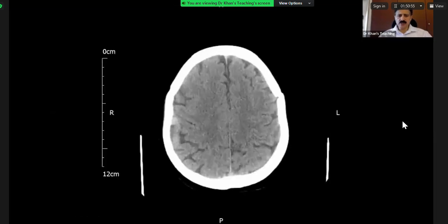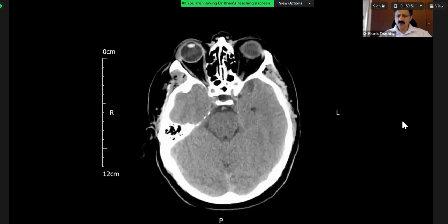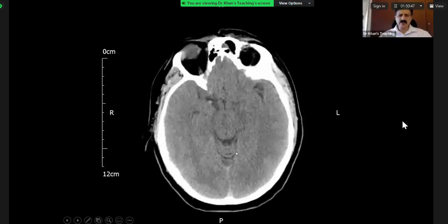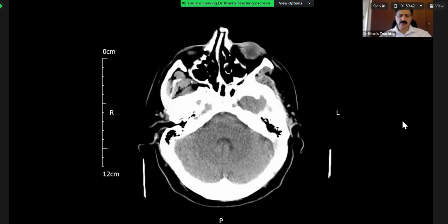Candidate 4, are you with us? No. Hello, yes, I am. Okay, now can you see my screen? Can you confirm that you can see a CT scan on your screen?